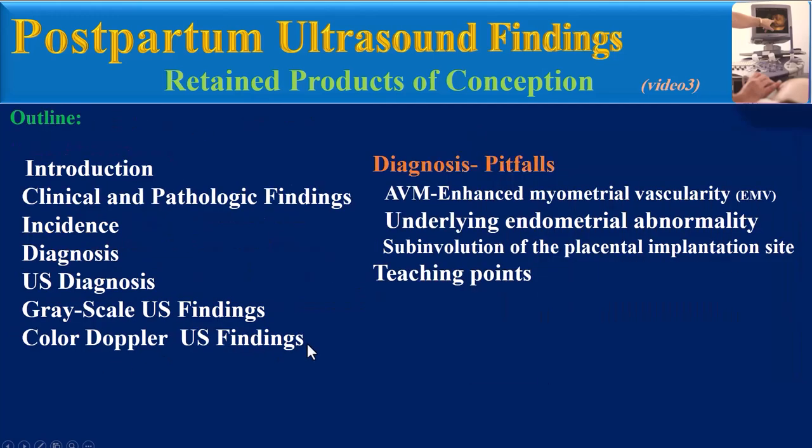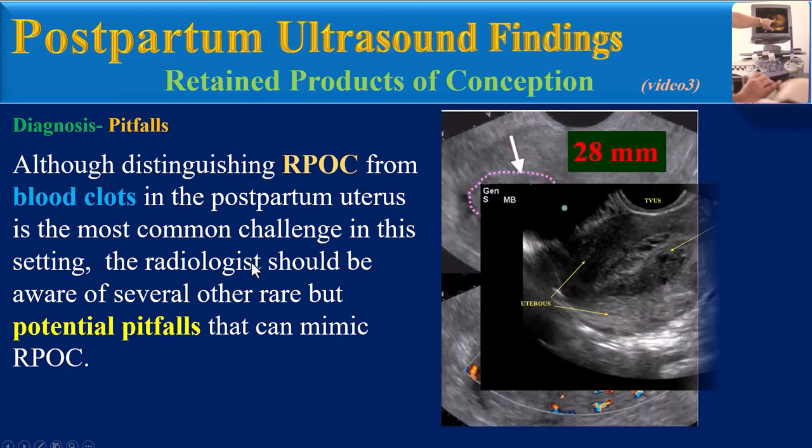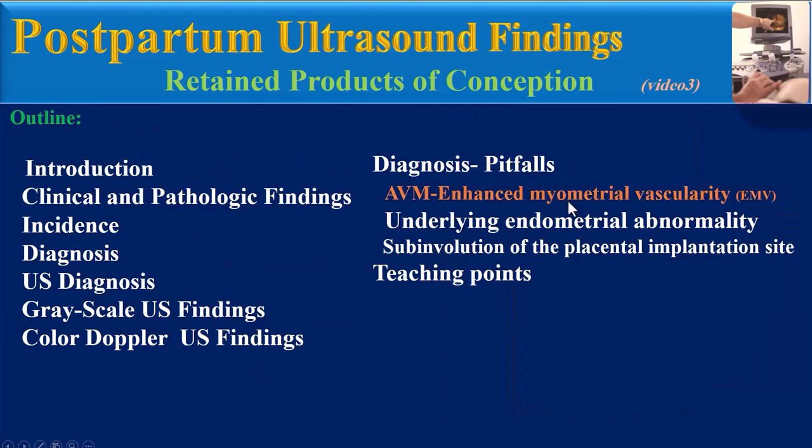Diagnostic pitfalls. Distinguishing RPOC from blood clots in the postpartum uterus is the most common challenge in this setting. The radiologist should be aware of several other rare but potential pitfalls that can mimic RPOC. AVM versus enhanced myometrial vascularity.